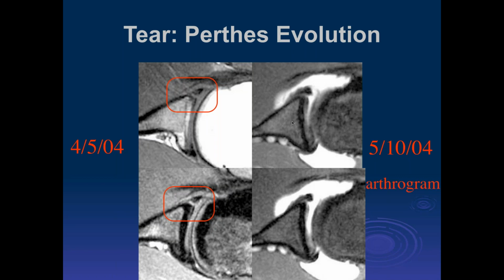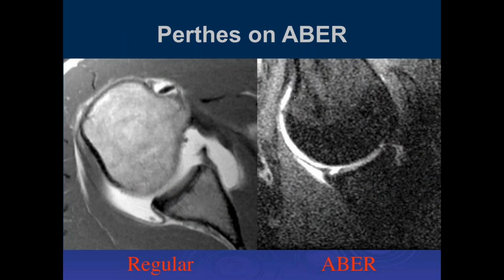Is that a peel back, John, that's healing? Yeah, you have an injury to the periosteal attachment all the way back to here. That's right, and it's healing with scarring. Posteriorly, which we'll get to a little bit later, these will often calcify, in which case, what's it called? No, it's not an ALPSA when it calcifies. Bennett lesion? Yeah, it's a Bennett lesion posteriorly, and the mechanism is these are chronic tears, and the healing of this chronic injury will calcify, and you'll get a little calcification. But we'll talk about that when we get to Bennett.